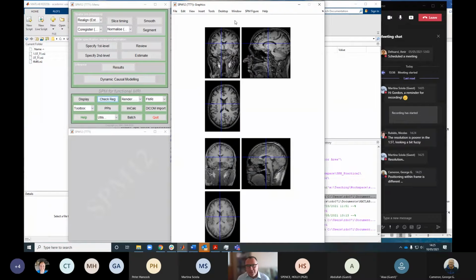Suggestions of the resolution. So at the top we've got a 3 Tesla MRI scan, and at the bottom we've got a 1.5 Tesla MRI scan. The resolution in these two images is very close to being the same. So it's not really resolution. They're both about 1 millimeter. I think that unless you're an MRI physicist, maybe the answer is not quite that obvious. When you're thinking about resolution, it's the signal to noise ratio that you're looking at, or even the contrast to noise ratio.